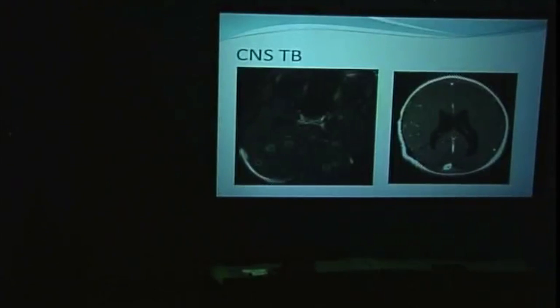This one is a post-contrast MRI showing leptomeningeal enhancement, so it goes into the sulci. There's thickening and enhancement of the meninges, which is abnormal. This again was another case of TB meningitis.